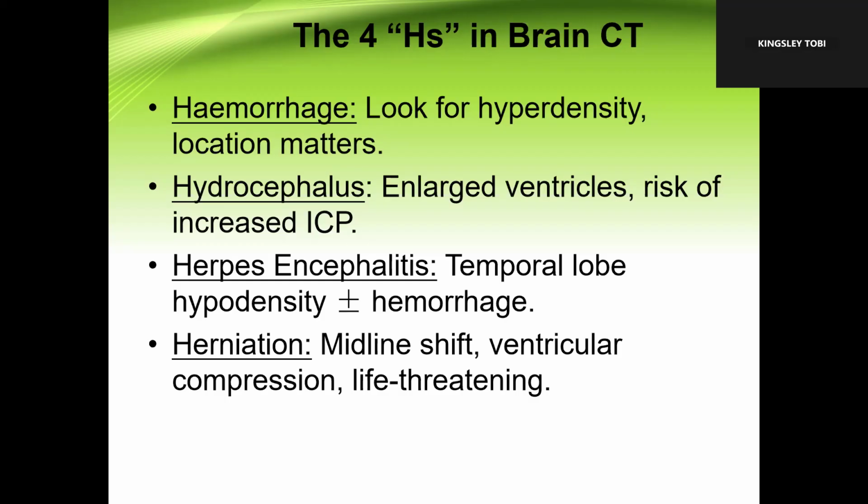And it's not for the neurosurgeons to come and bamboozle you. Can't you see? No, there's no hyperdensity here. All the structures I'm seeing are isodense. The guy will buckle up. Anytime he wants to come and bamboozle you, he will think twice because he knows that you're on top of your game. And that's what I'm trying to do, to make you at par, if not above, any of your non-anesthetic colleagues, okay?